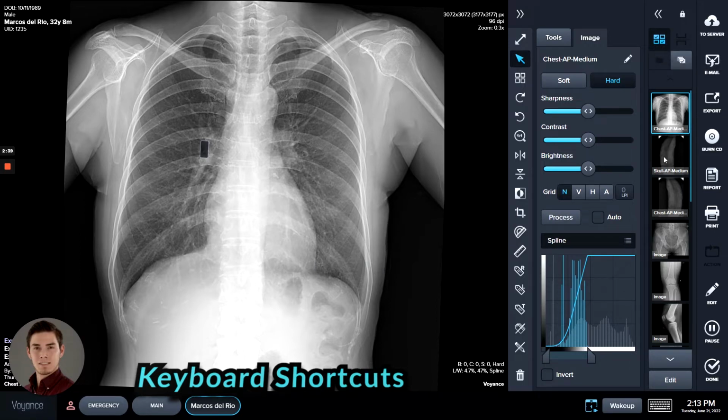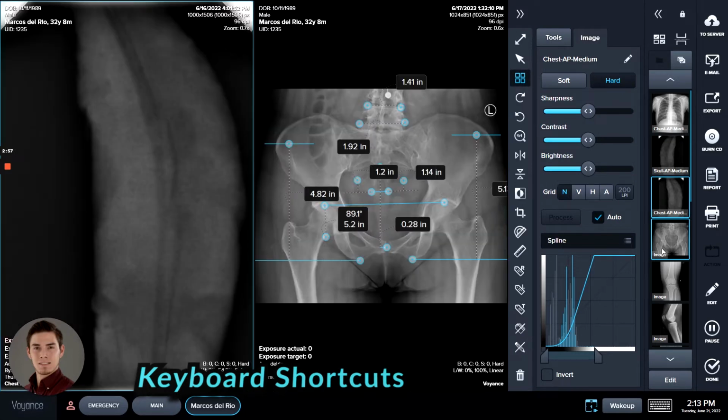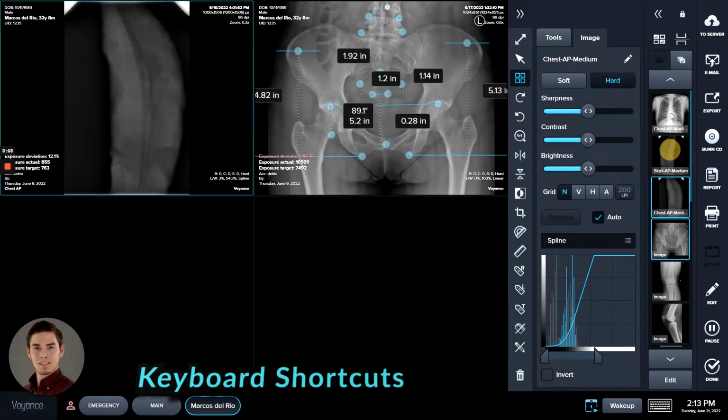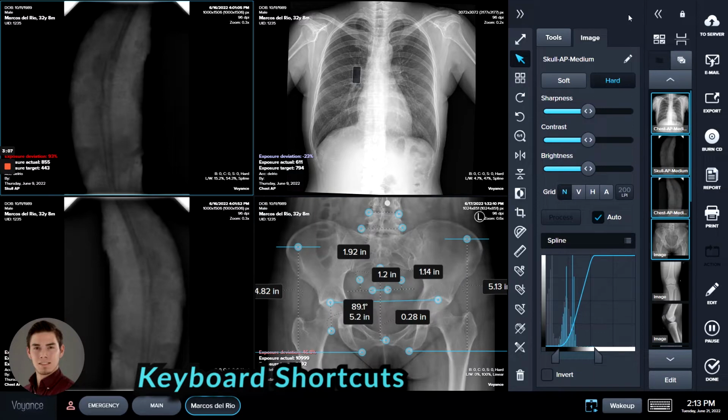In multi-selection mode, you just select anything that you want, highlight it, or unhighlight the things that you do not want, and then get out of the multi-selection mode. This is most useful when working with things that need multiple selections, like these multiple image views, and you can select in that way.